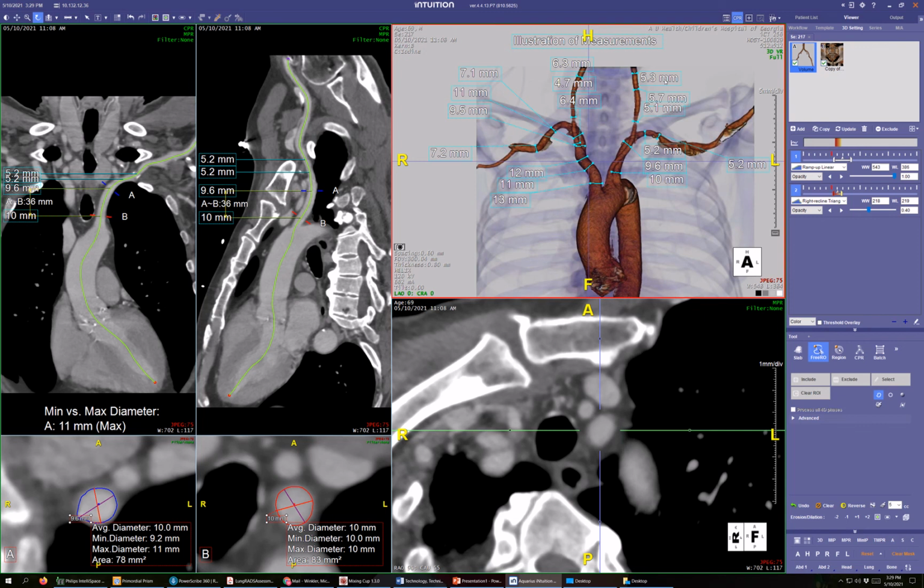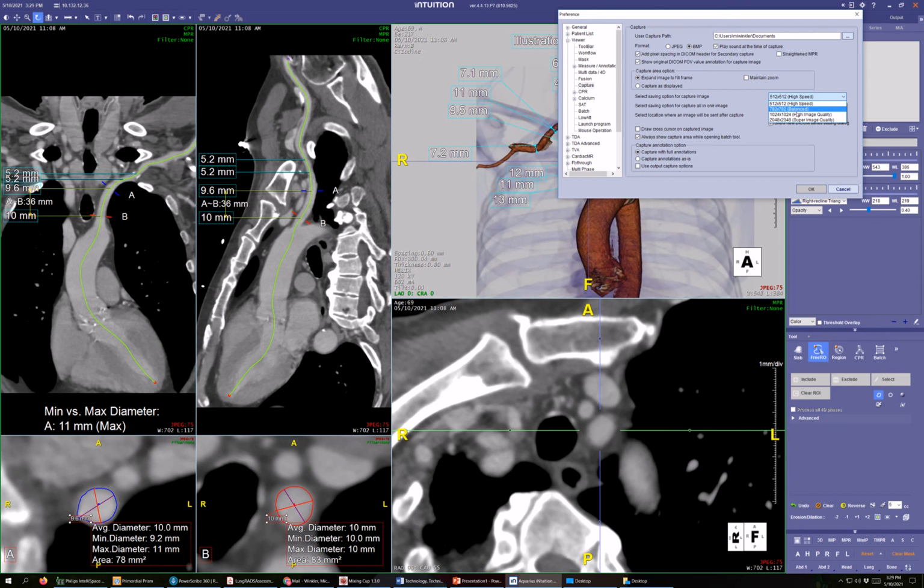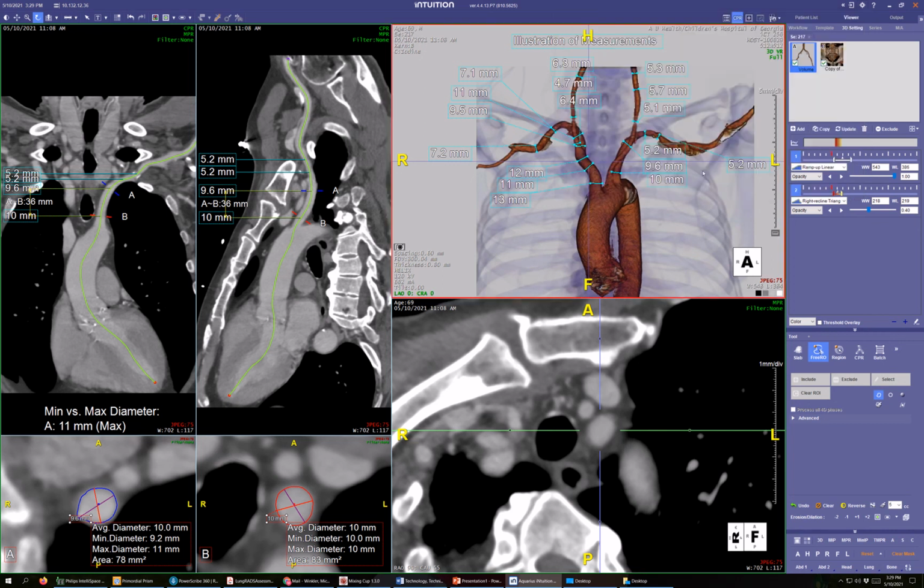So the pictures get distorted. Now one thing is because when I did the noise reduction, I changed the matrix to a less high resolution matrix. I have to change it back now. Okay, well that works.